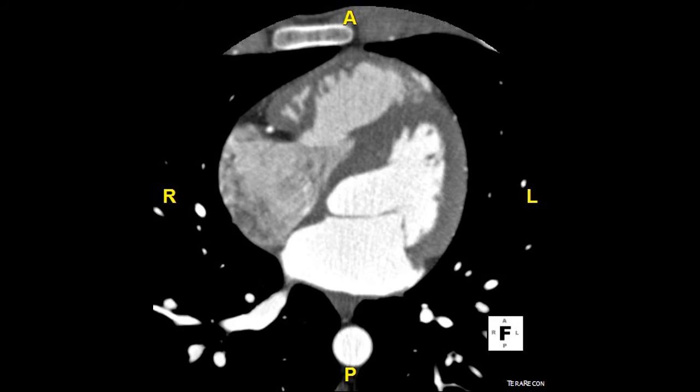The interventricular septum is starting to come into view, which is a very high yield structure, and I'll outline that in blue right now. We will see it elongate and become even more defined in the next few slides.